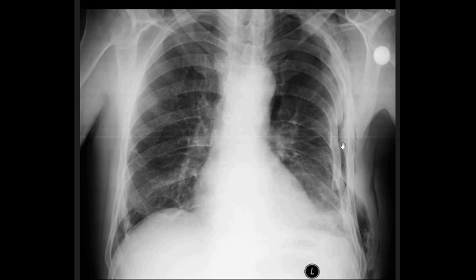And we can see that here is some space, this dark space, where we would expect to also see lung vasculature, but we can see that there is no lung vasculature. So actually here is also a small partial pneumothorax. One interesting thing to identify on this X-ray also: we see how here this is the subcutaneous tissue. So here would be somewhere the skin, and this is the subcutaneous tissue.